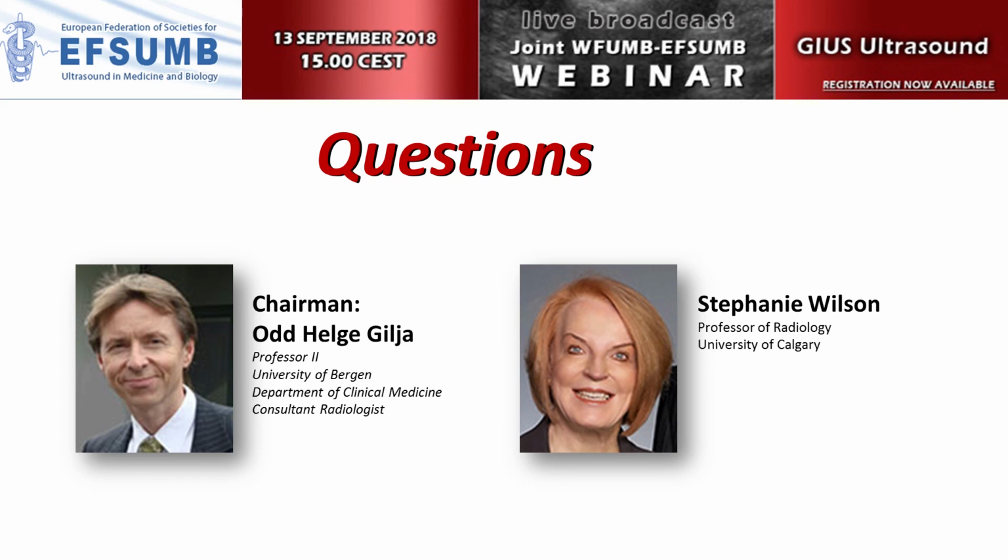And so if we have that appearance, and then we always do contrast enhanced ultrasound, many patients that I would have called 20 years ago just chronic inactive disease, I now realize they're acute on chronic. And so that's determined in my mind by a combination of elastography, grayscale showing that thin or echogenic submucosal layer, and CEUS.